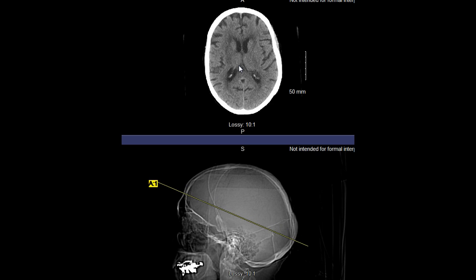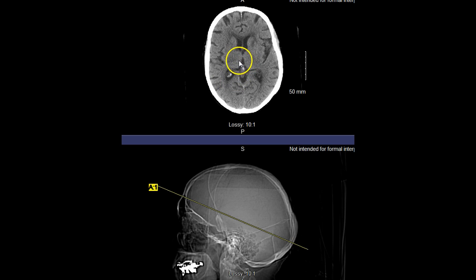As we continue to go through, you can see the splitting of those structures. So you can still see, yes, there are still lateral ventricles. It could be called the anterior frontal horns here and here, or the posterior, or occipital, horns back here. Again, you can see a little bit of the choroid plexus there as well. So the next structure that we really should be able to see is going to be the third ventricle. And we can see that structure of the third ventricle here.